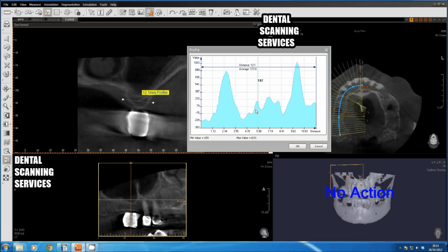So what this tells you is that you would not dream of placing an implant and immediately loading in bone like this. If you're going to immediately load an implant, then you really would want a density measurement in excess of 1,000, and in the posterior maxilla, even then, restoration should be splinted, not individual.